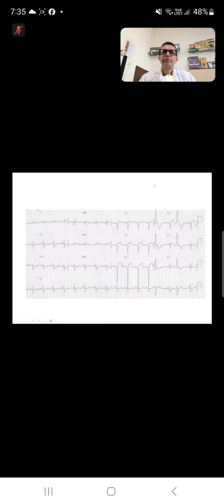So who would like to take this ECG? Just unmute and start reading.